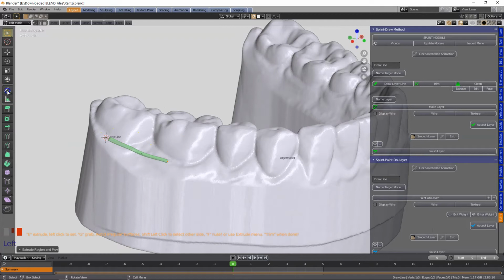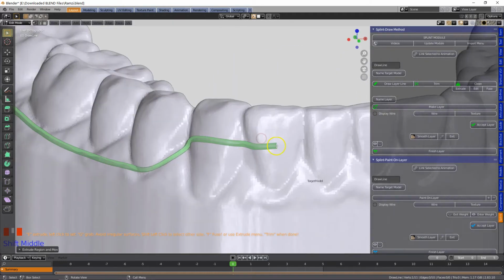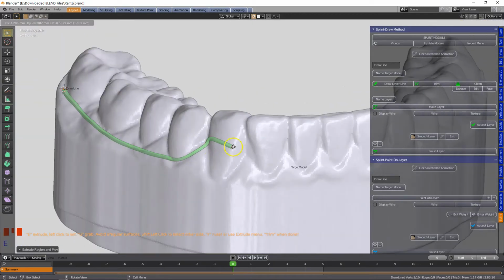Now we're relying a bit on surface area to get retention. In the past, when we used acrylic in the laboratory, and the client would ask us to only do it halfway, then we would get them coming back, and we would have to put a clasp in there to retain it in the mouth. Now with 3D printing, it's no good putting it up halfway on the tooth, because we need to engage undercut, else the patient's going to come back with a loose splint in the mouth. So we'd like to avoid that at all costs, and therefore we need to plan how this thing is going to clip into the mouth.